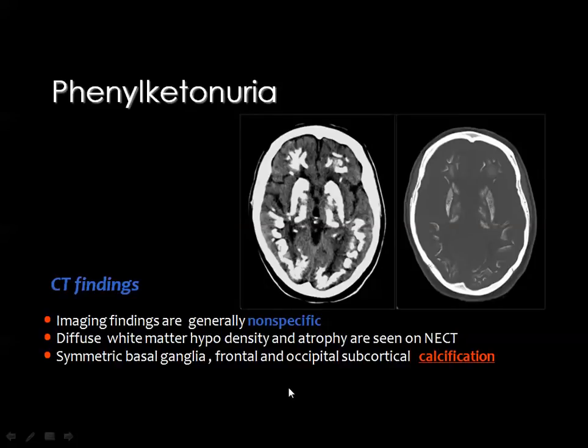The manifestations are usually non-specific, but it can go in the differential diagnosis of extensive basal ganglia and white matter calcifications.